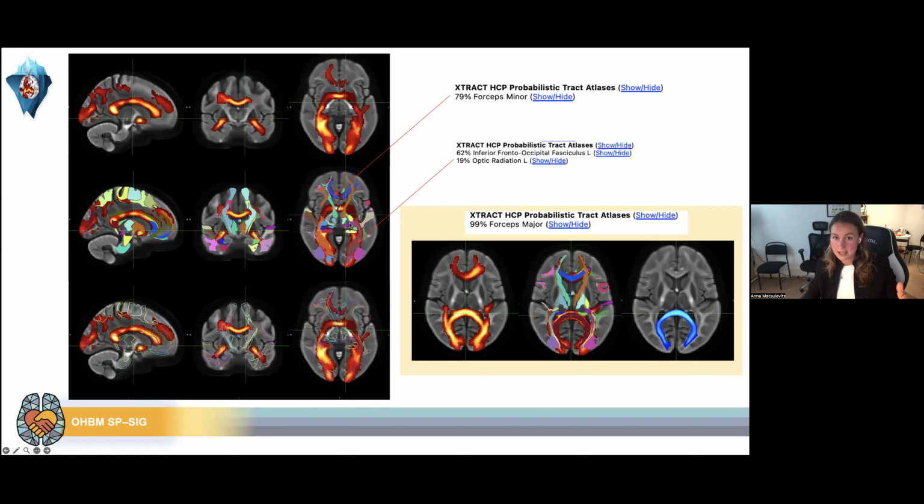And you basically overlay it with the tract atlas. Then you can just play around a little bit and check out which fibers are actually disconnected. So you might have your lesion, and nobody knows all the fibers, so I'm taking that back. It's hard sometimes to distinguish those fibers, right, if you haven't been looking at them for 20 years in your research time.